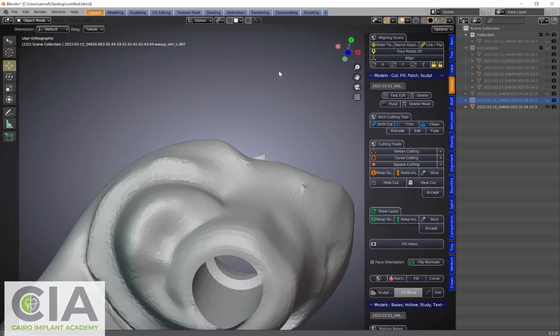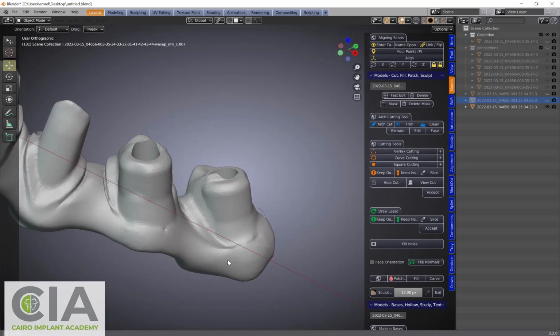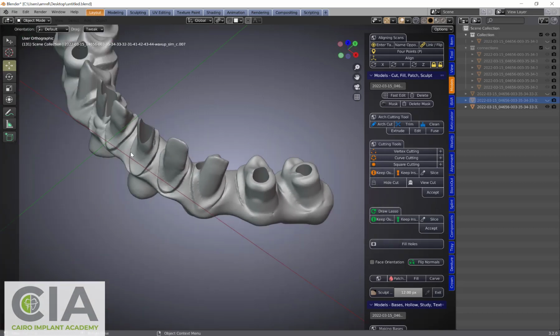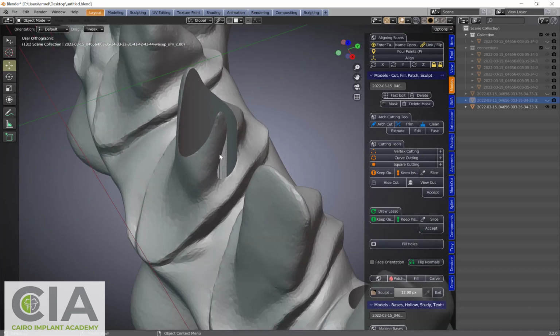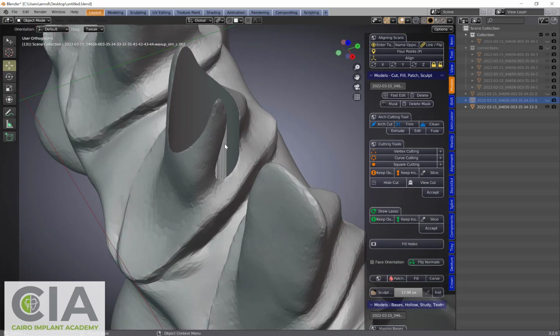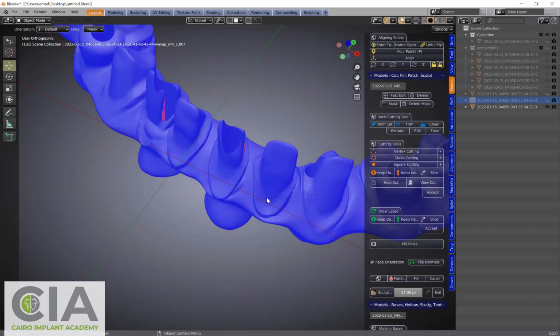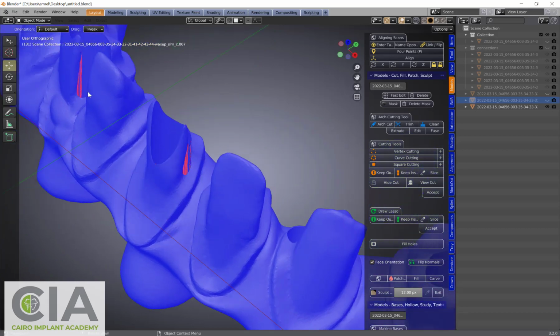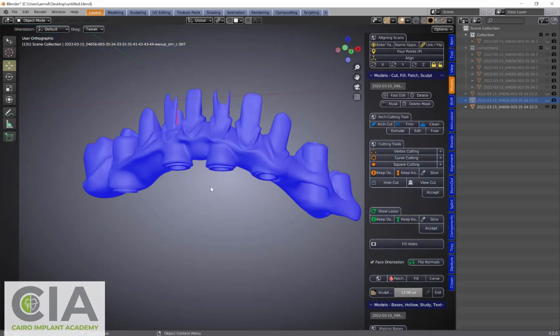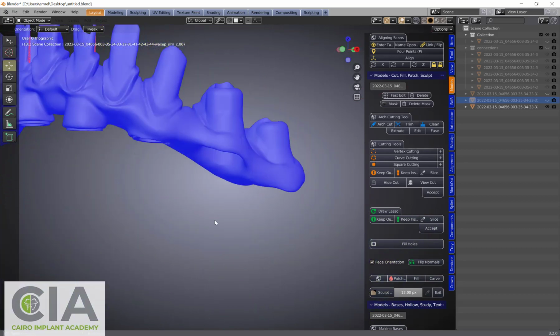You see here there are some loose meshes. Also, you can check at this side the channels are not continuous, and there is something corrupt here, right here and right here. When I inspect the mesh position, you can see that these meshes are inverted, so the CAM software will probably not identify this properly.